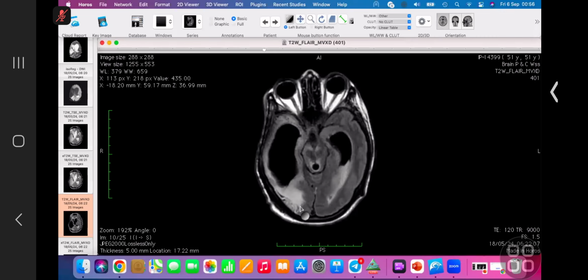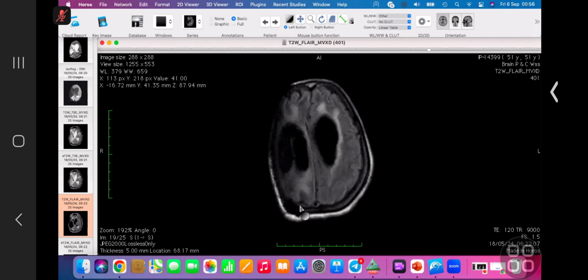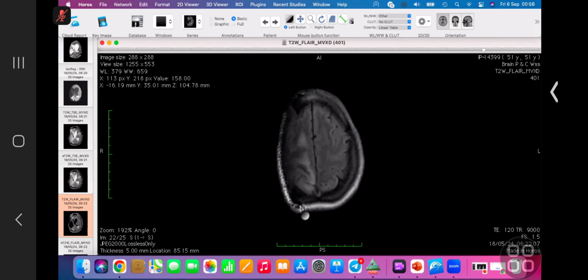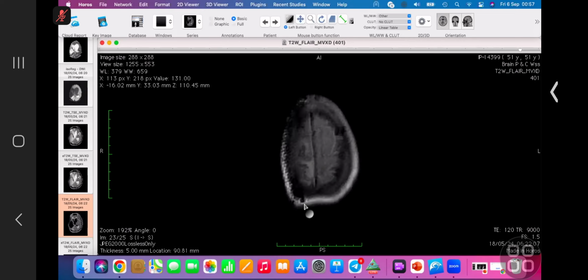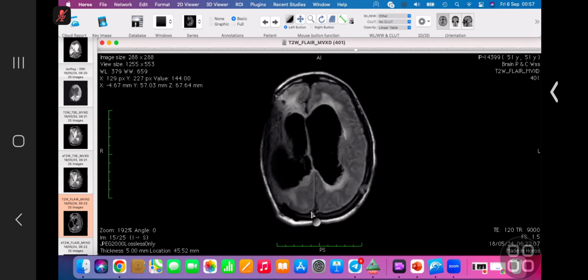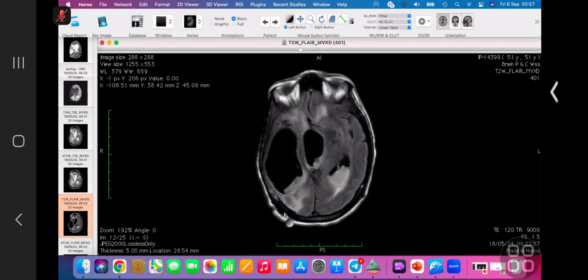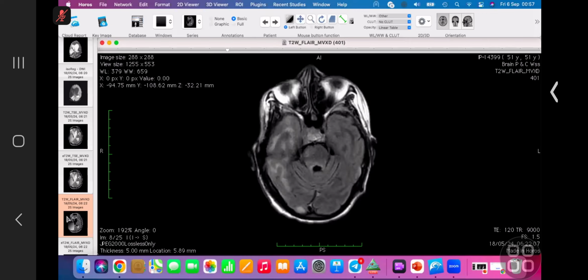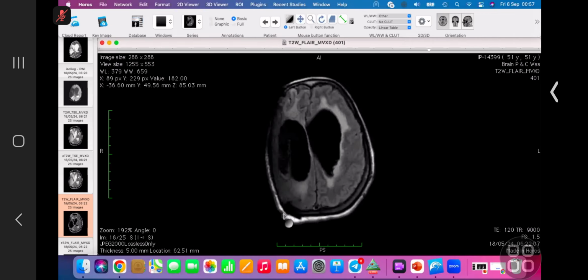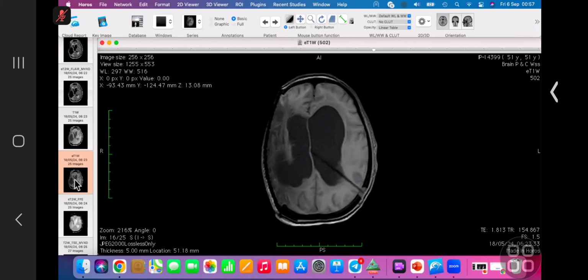So there is white matter edema in the FLAIR, and dependent content that is not suppressing in the ventricles. The extra-axial fluid also didn't suppress, so I'm suspecting extra-axial hematoma at the right cerebral convexity, in addition to intraventricular hemorrhage. That is my top differential, but another possibility, if the patient presented acutely with fever, would be intraventricular pus, but maybe I will check the T1 and T1 post-contrast.